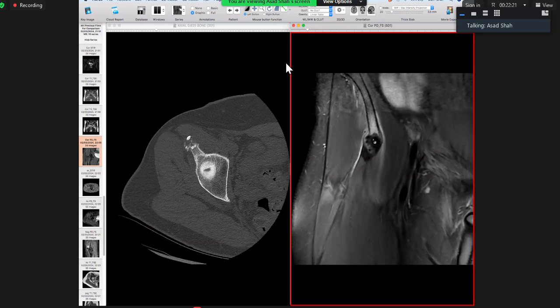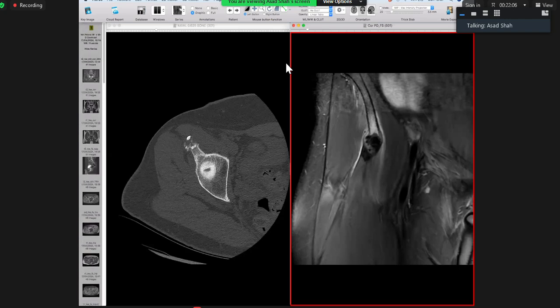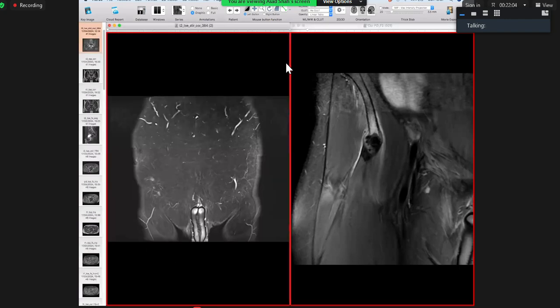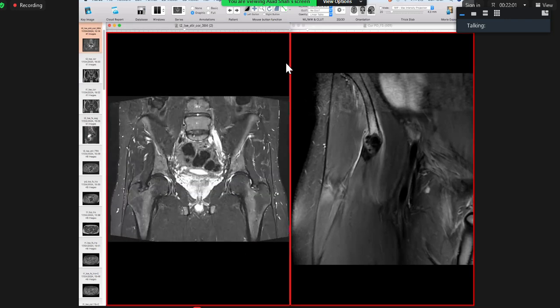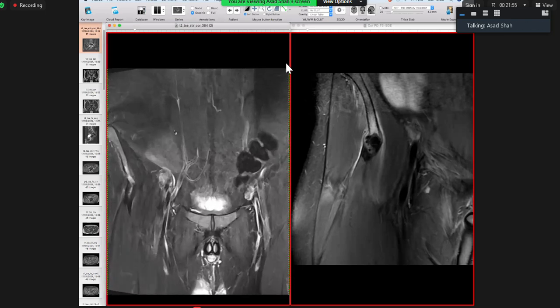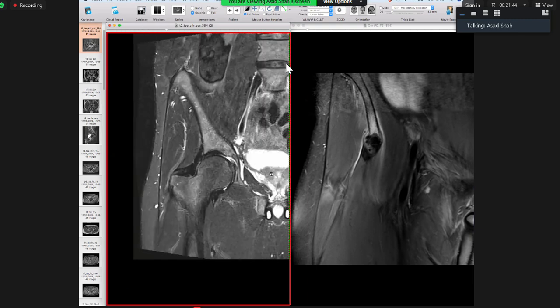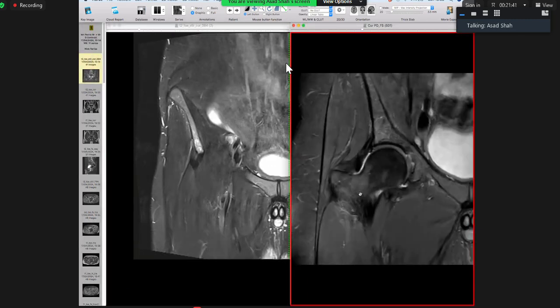This is all calcification going in this black stuff. I mean, this could be gout, fair enough, but this is calcification which is just causing all that reactive change. And I say that because I'm going to show you the MR after 4 weeks and look what has happened. So it is much better. It hasn't got worse. The patient just had some naproxen or something like that. And within 4 weeks, that calcification has gone. That edema is still there, but not as florid as it was when it started.